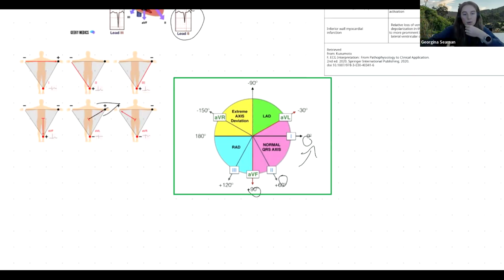Let's talk about a more extreme example: if AVF is on the halfway point, so the QRS is perfectly even, then we start to think that AVF might be a perpendicular view, and the voltage is not heading mostly towards AVF, it's heading across rather than towards AVF. That's when we might start to see right axis deviation. We'll also see that mirrored in lead 3, where we'll see a really positive deflection, so it'll be mostly positive in lead 3.